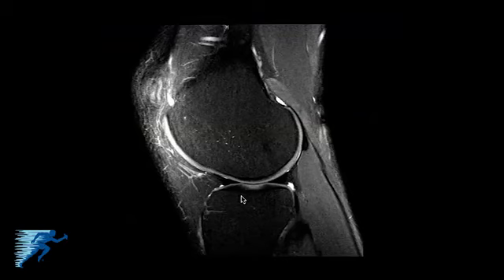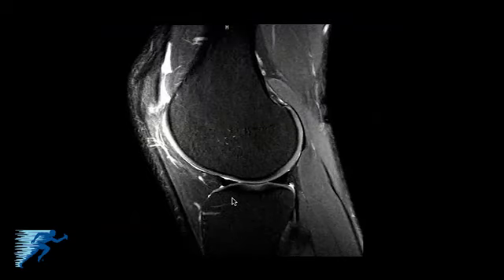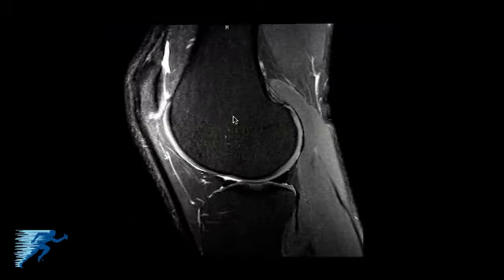We're getting close to the center of the knee here, but one can see the articular cartilage, which is this gray area on the lateral femoral condyle, and then we start to see the articular cartilage of the lateral aspect of the trochlear groove. Now the patellar tendon has come more into view, and we're starting to see the patella as we get more central in the joint.